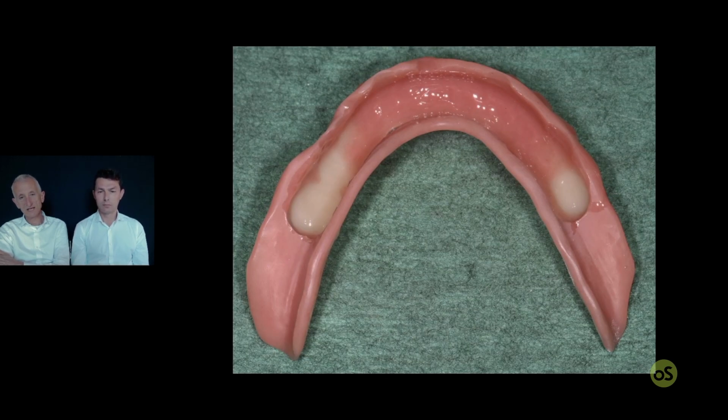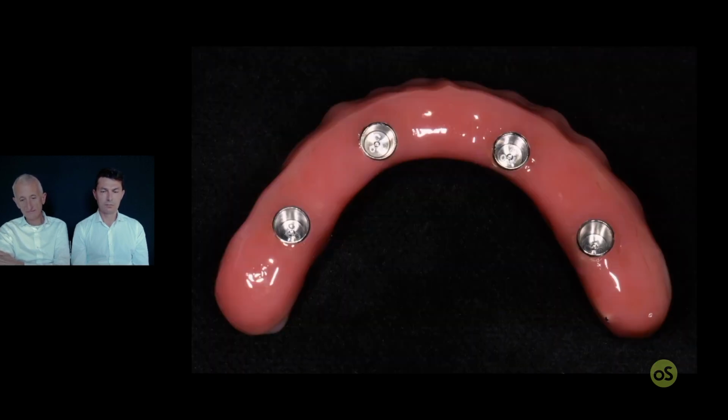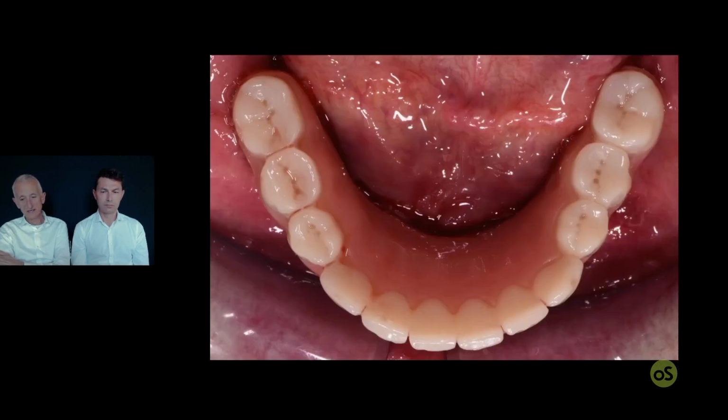Then this is the digital denture shell that has been hollowed by Gianluca in order to house the framework, and the final prosthesis trimmed and finished and ready to be engaged with the conometric friction.